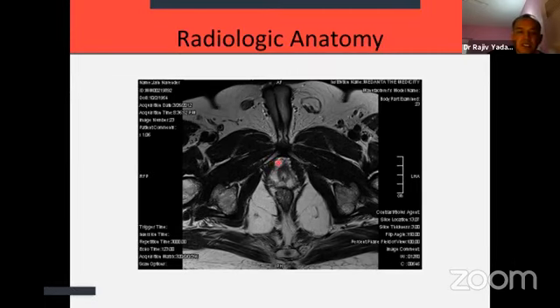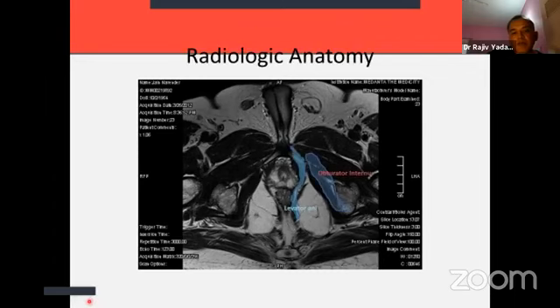Now, the urethra is seen here. This is just marking the levator ani, wrapping all around. So why is it important? Because if there is, for example, a wide tumor here, and the interface between the levator and the prostate is almost gone, that matters. Normally you don't see a gap here. When you do surgery, they separate it out, but still you can see the density of the tissue is different.